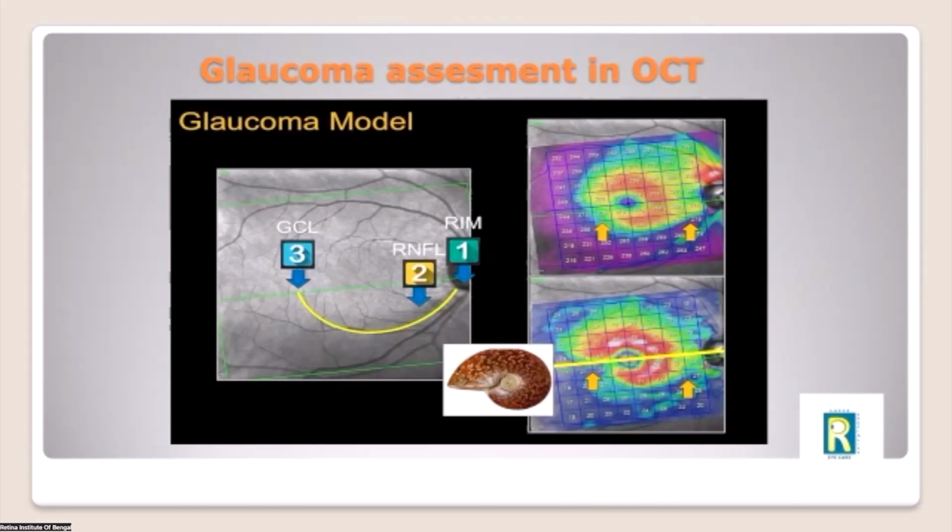If you think that way, then it becomes very clear that there is a dissimilarity between the superior and inferior part here. The blue area is seen in the inferior RNFL area, but in the superior it's not there. So the glacial lake is melting and a river is appearing, which is coming straight down from the mountain. And this is the first thing that happens in glaucoma. Either in the superior or inferior arcade, preferably in the inferior arcade, we start noticing the defect.